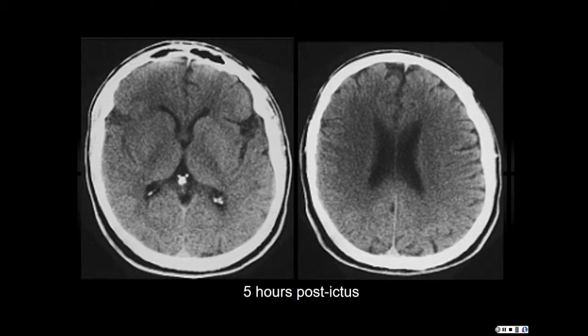You've seen the MCA sign, when the MCA was chock full of dense thrombus, resulting in a large territorial infarction. And now you've seen the cortical ribbon sign at work, also indicative of acute ischemia. The MCA sign is the actual thrombus. The cortical ribbon sign is the result of the ischemia, resulting in edema and loss of gray-white matter differentiation.